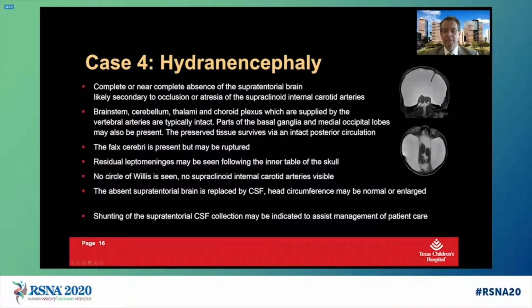We call it ventriculomegaly because it is most likely still a kind of widened dysplastic ventricular system, and for that reason, in rare cases, you have to shunt it because a big head makes it almost impossible to take care of those children who barely move, resulting in injury to basically the skull and the skin.